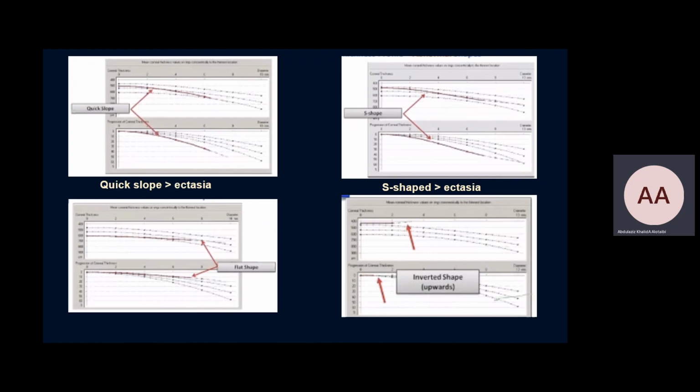The first on the left, can anybody read it or tell us the concept of it? What do you think? I think the line shows the center of the cornea and the thinnest section of the cornea. And then as you go peripherally, the thickness increases.